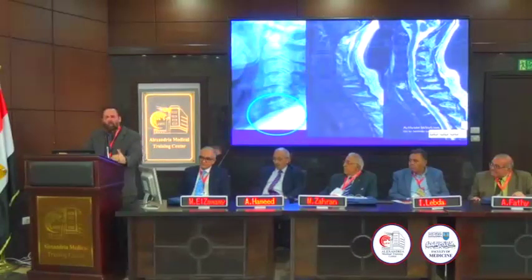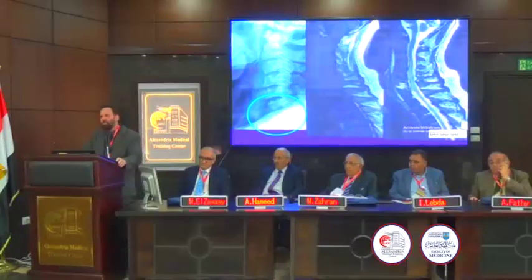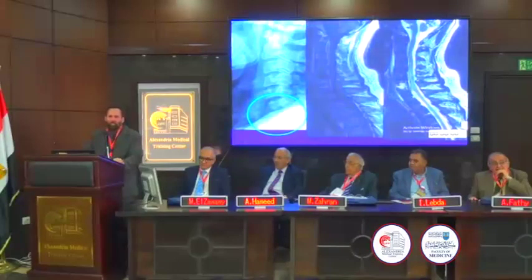Septic arthritis always has effusions, uniform joint space loss that we said. Osteomyelitis we went through, but stress the trapped fat sign. Chronic osteomyelitis, look for sequestrums and involucrums, but other than that, just shows evidence of healing with a periosteal reaction and sclerosis, and often defects where the patient was previously drained. But tuberculosis and other non-pyogenic organisms can look very much like chronic infection.